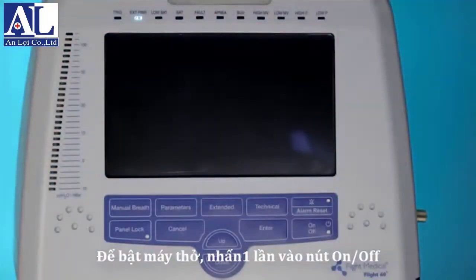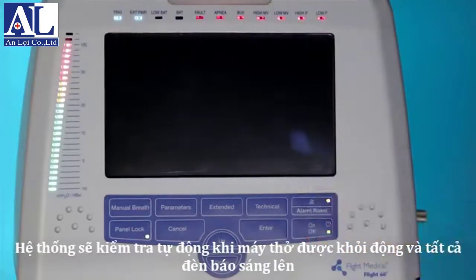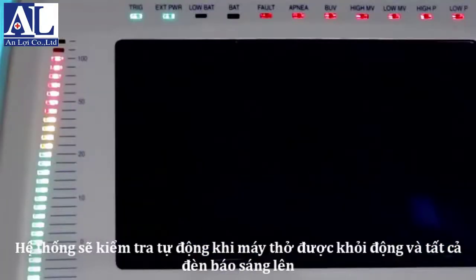To turn the ventilator on, press the on-off button once. A quick self-test is automatically performed when the ventilator is turned on and all LEDs illuminate.